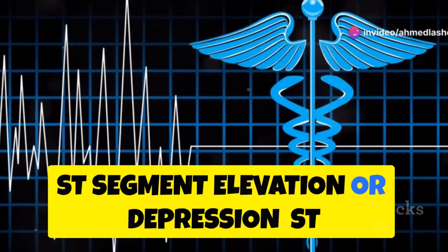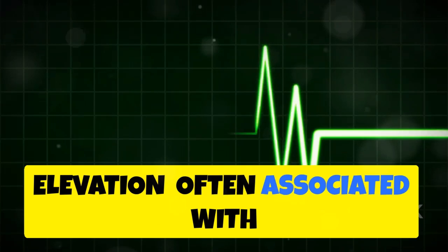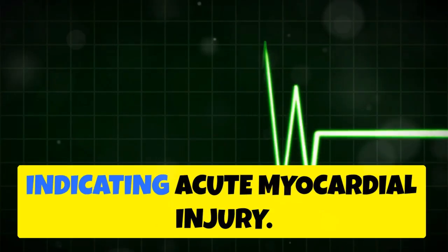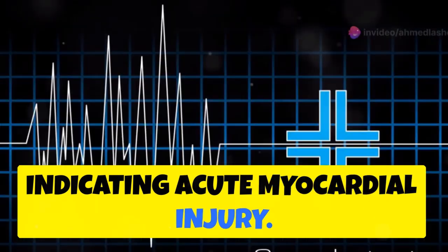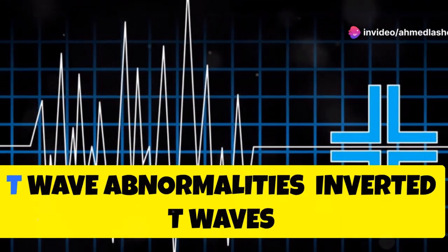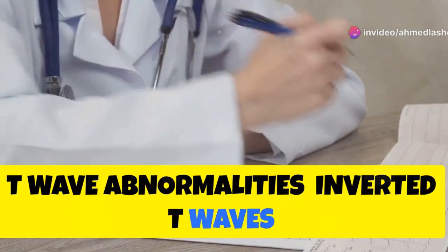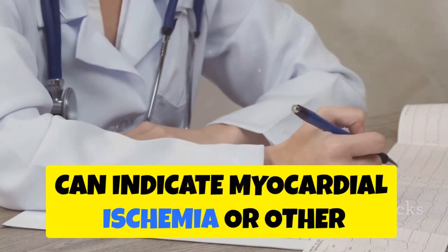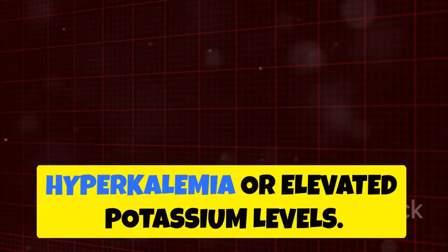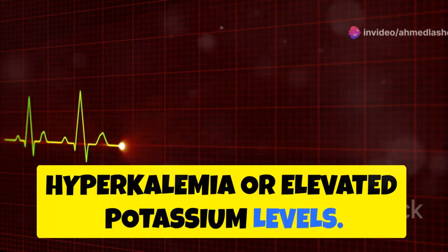ST segment elevation or depression. ST elevation is often associated with ST elevation myocardial infarction, or STEMI, indicating acute myocardial injury. ST depression may suggest myocardial ischemia or angina. T-wave abnormalities. Inverted T waves can indicate myocardial ischemia or other cardiac conditions. Peaked T waves might be a sign of hyperkalemia, or elevated potassium levels.